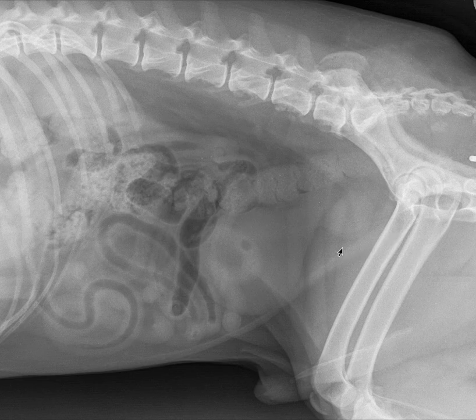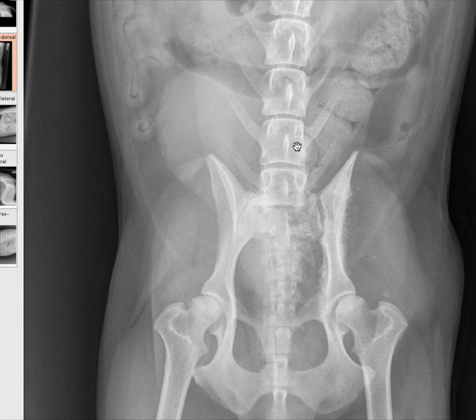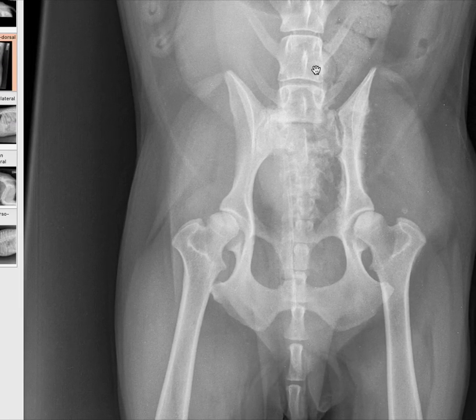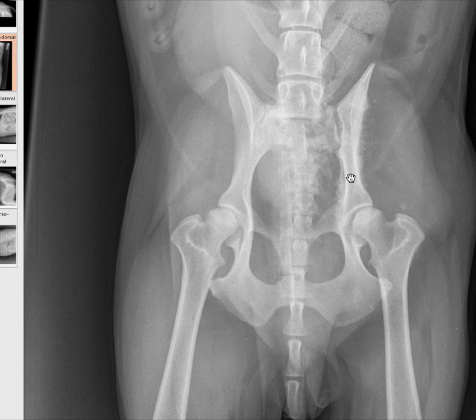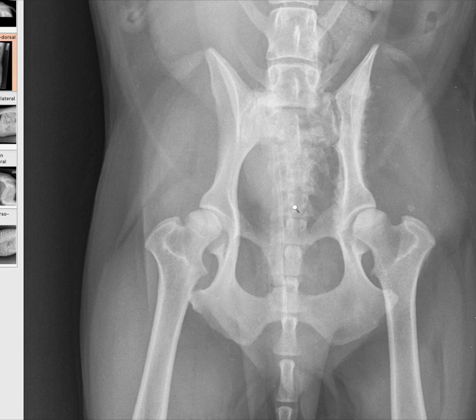Now, although these are abdominal radiographs, I do want to focus a little bit on the bony structures for this case. When I'm looking at osseous features, I try to compare the findings that I see between those that are consistent with an aggressive or a non-aggressive bone lesion. So let's use this as an example to go through my checklist for an aggressive bone lesion. We can all see that the appearance of the left ilium is abnormal when compared to the right.